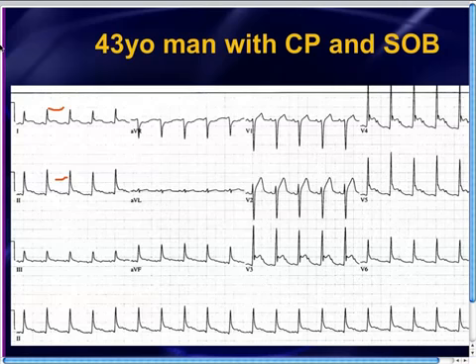The way I think of it is if you put a drop of water right in there, would it immediately spill out or would it kind of sit there? And I think in most of these leads, it would kind of sit there. Pretty much everything you're looking at is fairly concave upwards. V1 and V2 are kind of tough. They're kind of straight, but maybe just a little concave upwards. If it's too close to call, don't read too much into it.